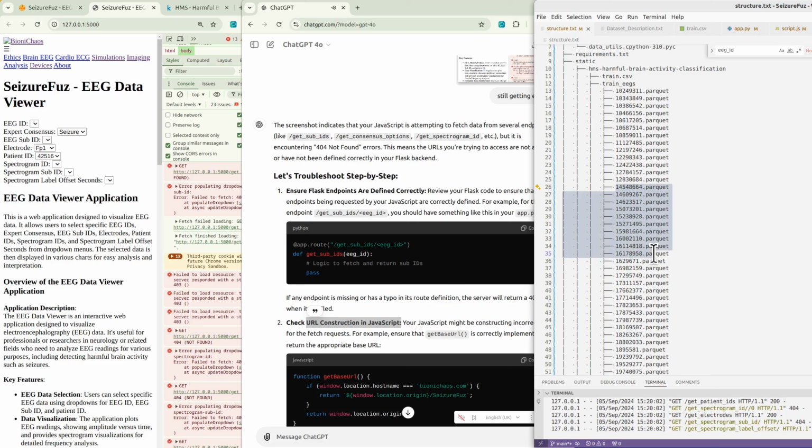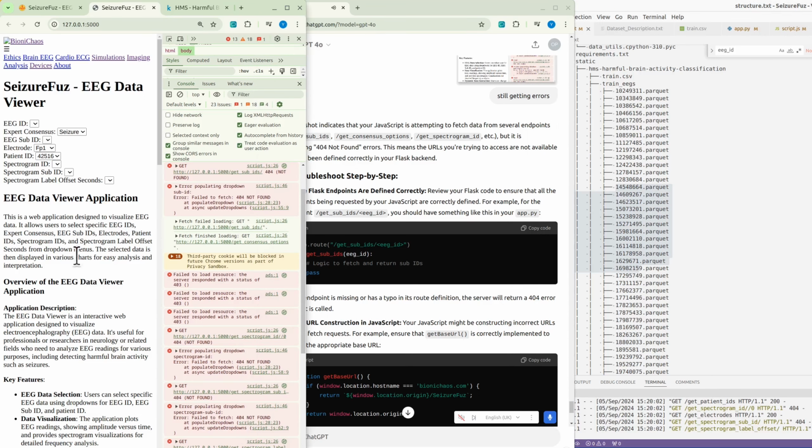Why these changes matter? These updates are like giving your application a turbo boost. By making it more responsive, smarter, and easier to maintain, we ensure that both the users and developers have a better experience. Users can now enjoy seamless interactions with the data without annoying lags or cryptic errors. Meanwhile, the developers can sleep easier, knowing the code is robust, well-organized, and ready for anything the future might throw at it. So, what does this all mean?